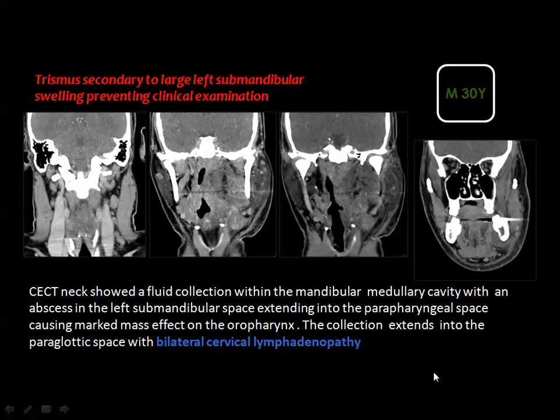And this is another example which represents a big abscess in the parapharyngeal space region here. This is the parapharyngeal fat on the right side, which is good. And here you see a big lesion, which is mainly of fluid density, containing some air loculi, and is related to an inflammatory lesion in the adjacent mandible. And if you look carefully, then you see some of the stranding and obliteration of the subcutaneous fat.